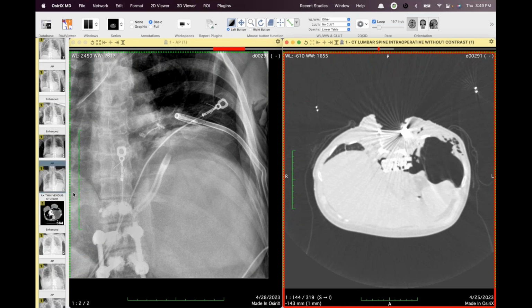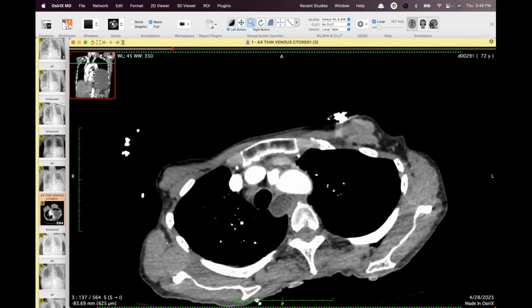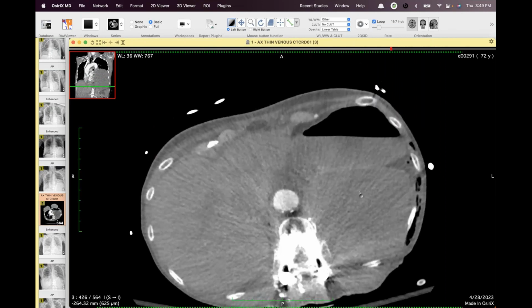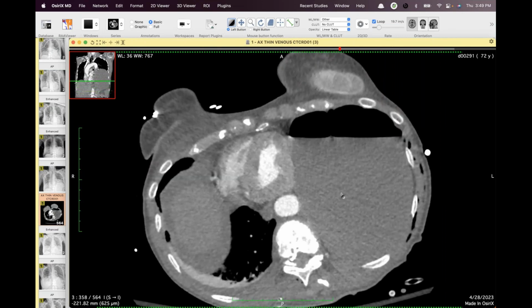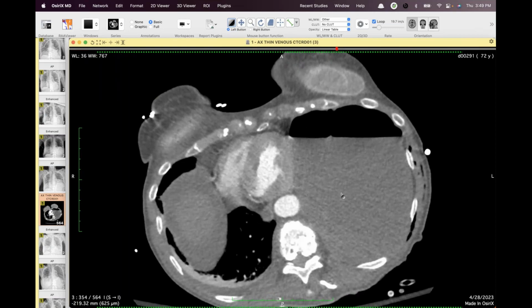Yes. And so I called the floor. The patient had a little bit of pain, but I told them I think you need to get a CT and figure out what this is. And it turned out, not good, that's all stomach. Jeez, that's all stomach, and it was incarcerated. Gastrothorax, yeah. So it was an iatrogenic diaphragmatic hernia containing ischemic, incarcerated stomach.